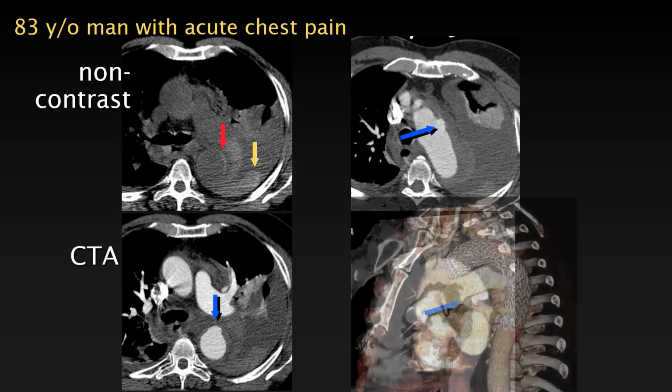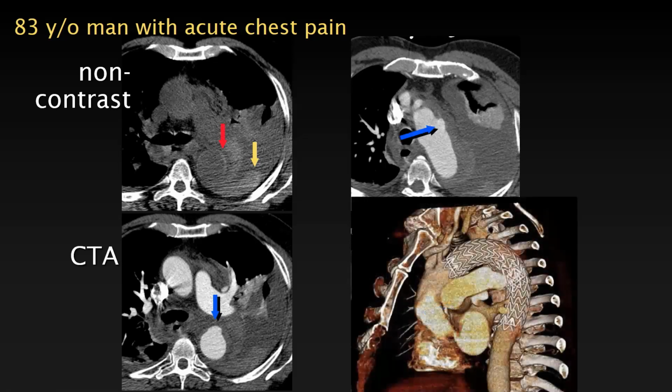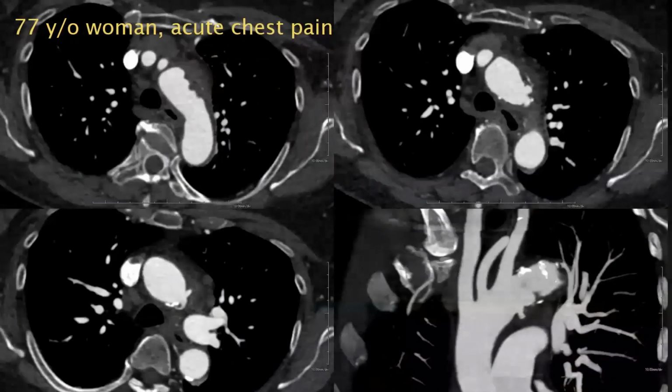So usually descending lesions can be just stent grafted, as dissections do. And many of these patients have a lot of comorbidities, and atherosclerosis usually everywhere. And so endografting is certainly the better treatment than any surgical procedure. So this patient is just from, I think, 2 weeks ago. Again, a patient presenting also with acute chest pain.